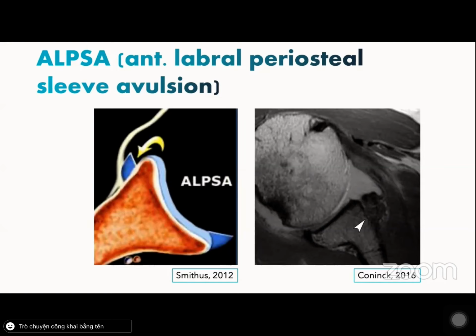the right, where we see a soft tissue scarring in the anterior aspect of the glenoid neck. Because the diagnosis of ALPSA lesion is most certain when the inferior glenohumeral ligament can be identified, it might be better seen on an MR arthrography.